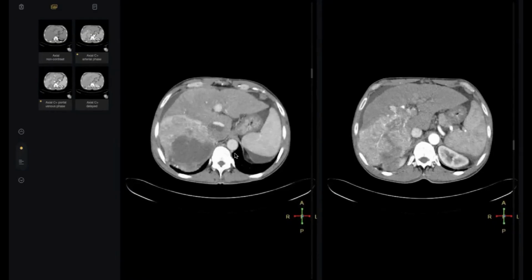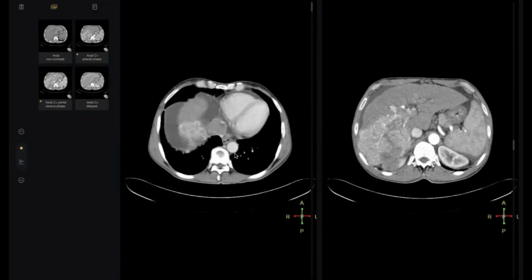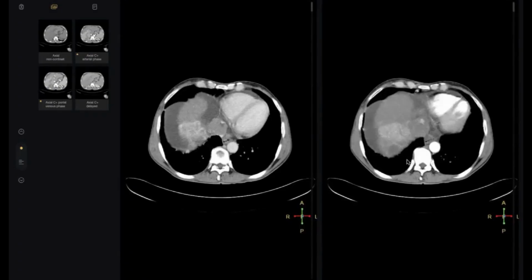Yes, IVC is also involved. So I will look at the hepatic veins also. What other structure should you exclude? You should tell the examiner, doctor, urgently, I wanted to examine another structure. I will help you. The tumor extends to the right atrium.